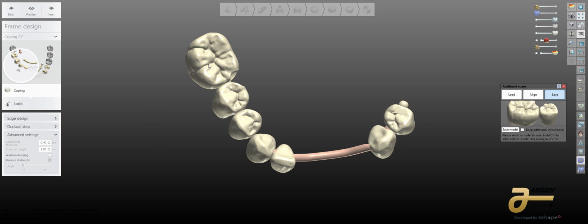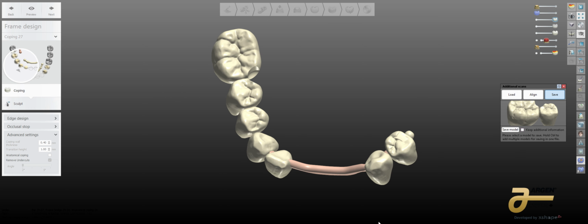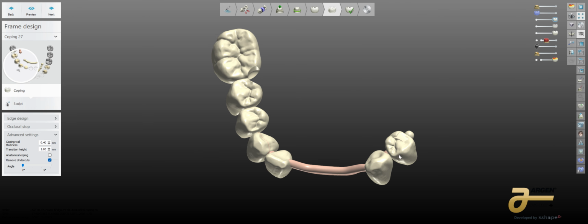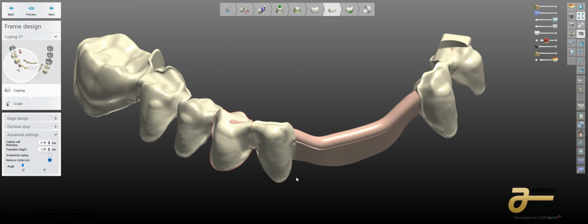But there are ways to bring this back in after you finish: copy in a pen, bring it back in, set margins, bring the anatomy for reuse in, and cut to the margin with drill compensation, all that stuff. I can tell you for certain it will work. Your margins are going to be bulky and it's not going to be as nice as what I've presented over here. But again, I'm sharing some fun strategies. I'm jumping all over the place to really share some things on what you can do inside of 3Shape here.